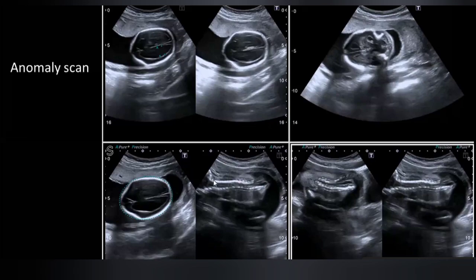And then you have to trace the spine along its entire extent. We see this is the cervical region, this is the dorsal region, and in the lumbosacral region, we find widening of the canal, and this was a case of meningomyelocele. And summing up all of the findings, this is Arnold-Chiari malformation.